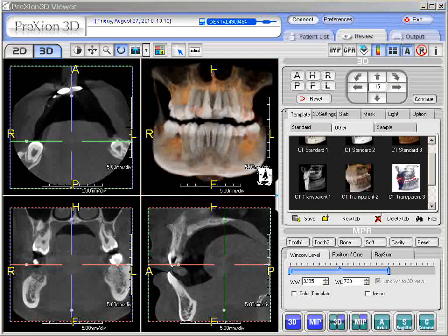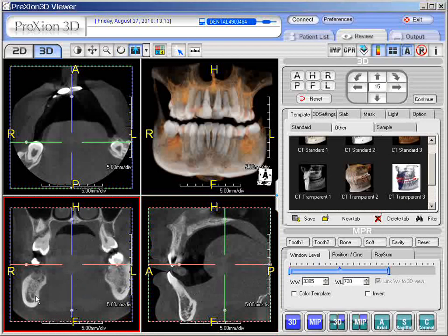The technique that I find helpful is to first locate the mandibular canal, depending upon which side you're looking at, and then to get it from the sagittal projection as a nice linear tubular structure. It's easy to mark the canals as we're going to demonstrate. First, let's look in the coronal view. We can always slice the middle wheel on the coronal view if we're not seeing the mandibular canals, although here we're seeing them very nicely.